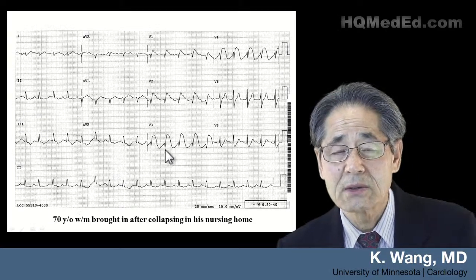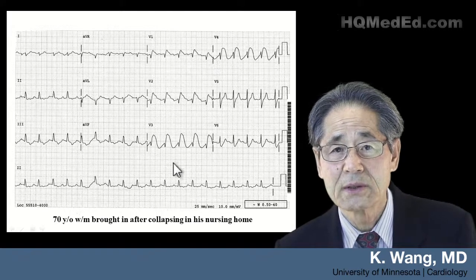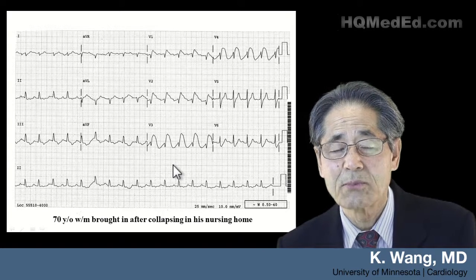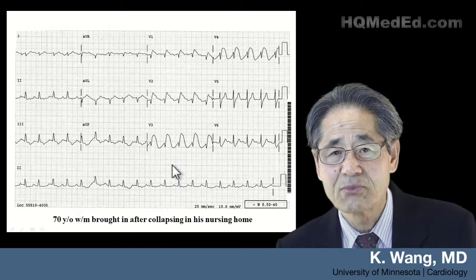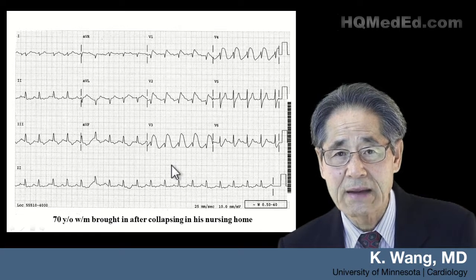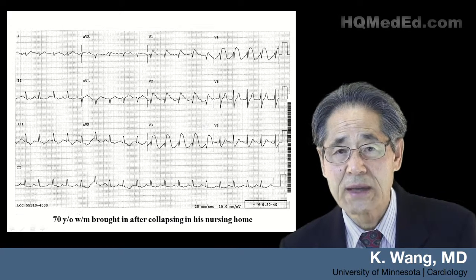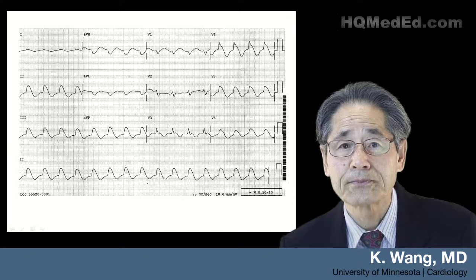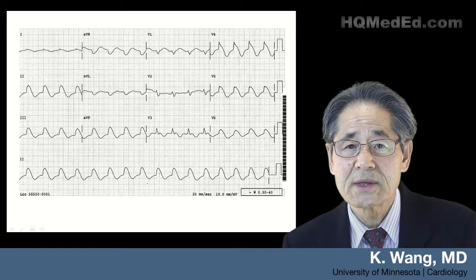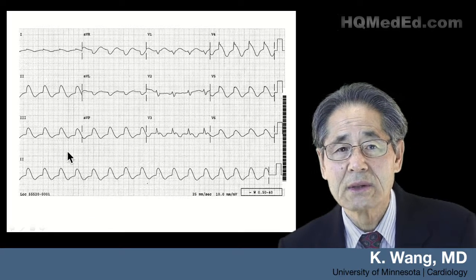This patient has a diffuse ST elevation involving the precordial leads, but this is from a patient who had a massive PE and the right ventricle is severely dilated, which is also known to cause ST elevation. We were seeing this patient in the surgical ICU, and we didn't know what we were dealing with.